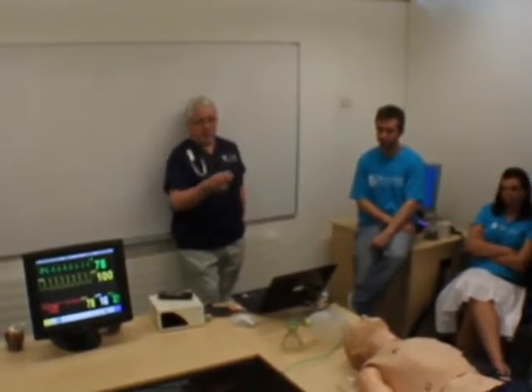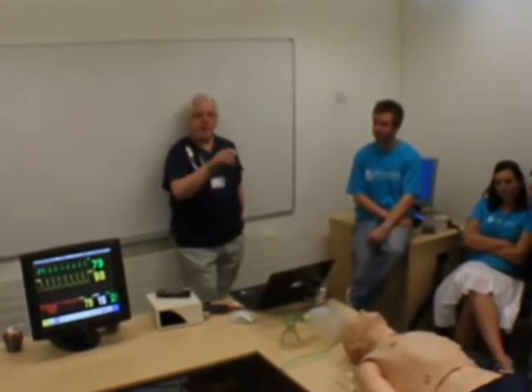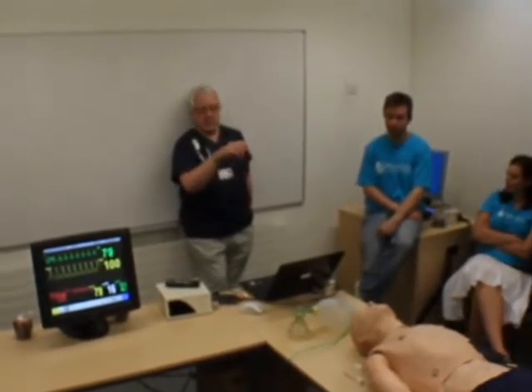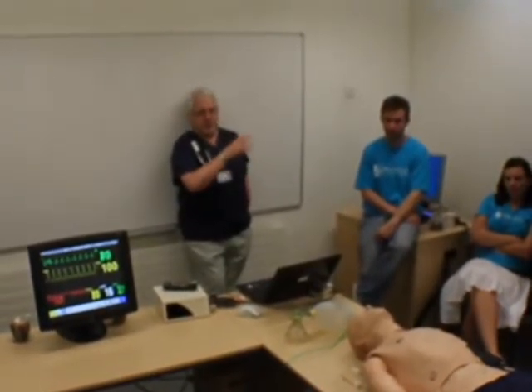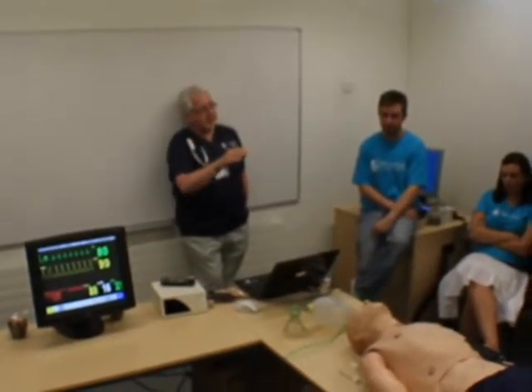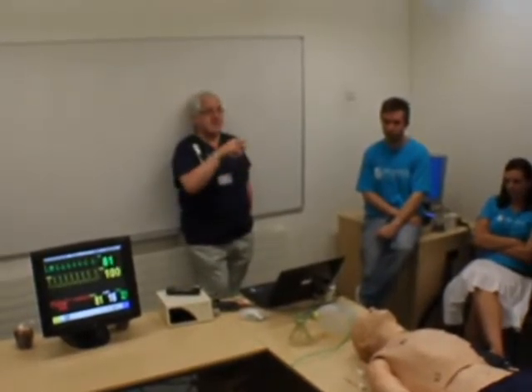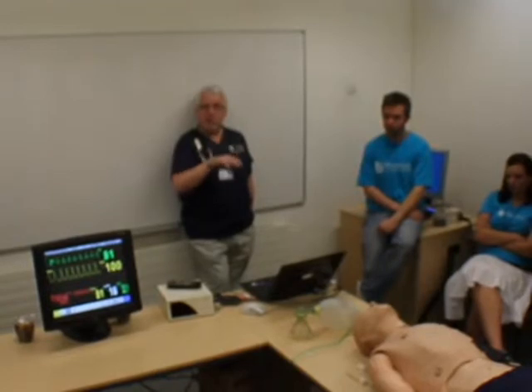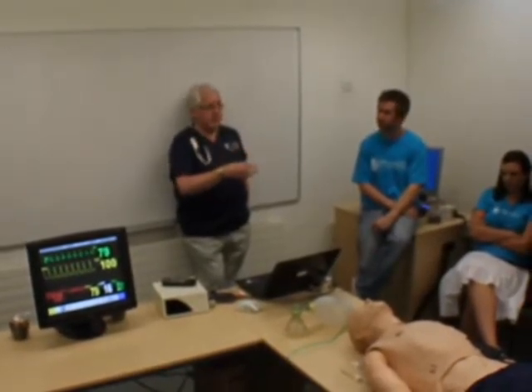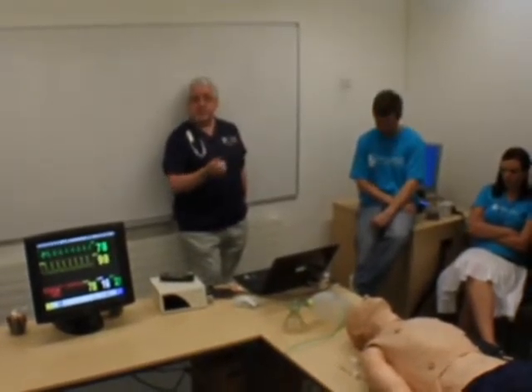And we've got programs which we run where SimMan mimics the effect of having lost a lot of blood, and the students will measure his pulse and they'll measure his blood pressure, his urinary output, and they'll put those on charts so they can see the effects that blood loss has on the cardiovascular system, and they can understand how this is working. And then we can do things like give him drugs or give him fluids to replace the lost blood, and they can see the impact of those interventions.